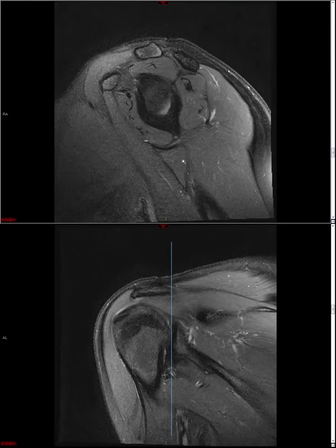In general, the checklist I follow for shoulder MRI includes the rotator cuff. Then I look at the acromion, the AC joint. We'll talk about the acromion morphology. I'll look at the subacromial bursa, and we'll talk about that bursa and other bursae. Then I look at the glenohumeral joint, and then the glenoid labrum. And then I finish off by looking at things that I'd like to put in the miscellaneous category, things like marrow signal, whether or not there are bone or soft tissue masses, axillary adenopathy, and so forth. Okay, so let's begin with the rotator cuff.